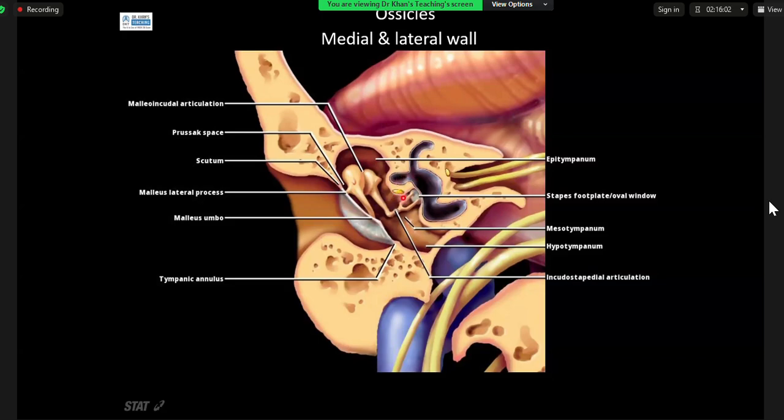This is the facial nerve, the portion we call the tympanic portion, which is passing inferior to that. Coming back to the epitympanum, the head of malleus actually joins with the body of the incus here. We'll come back to this point. But superior to that is this plate of bone, which is known as the tegmen tympani. And this is where the erosion was, and the candidate picked up this part of anatomy very well.